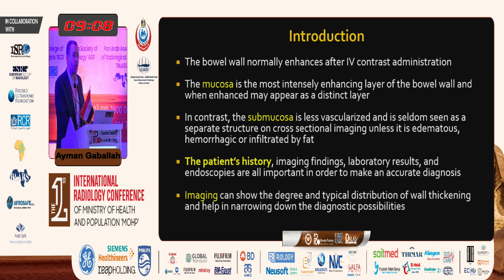As you know, the small bowel normally enhances, like any normal viable tissue in our body, with IV contrast. So if a tissue does not enhance, this means this bowel is already ischemic. Please be careful, because I see many of our residents in our institution often call the proximal small bowel, especially the jejunal loops, which are not well distended and by default are somewhat thickened compared to the ileal loops, proximal small bowel enteritis, which is not correct. Normal bowel should enhance. So please be careful about that.